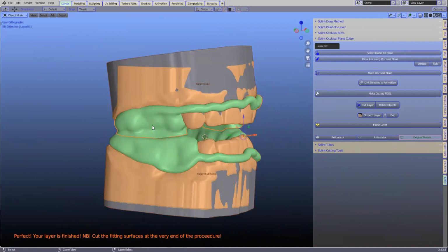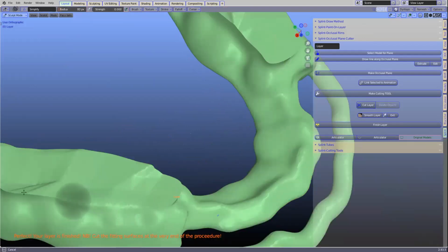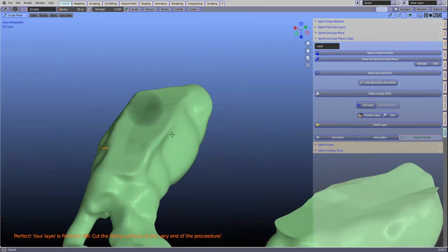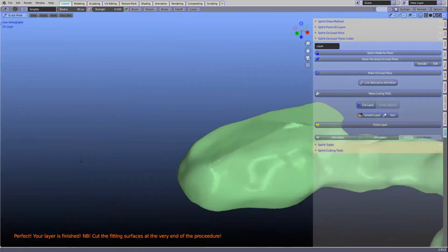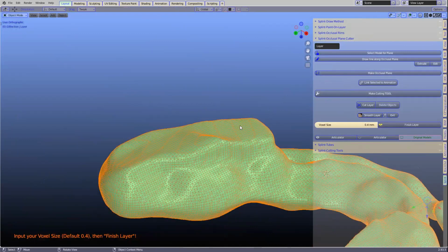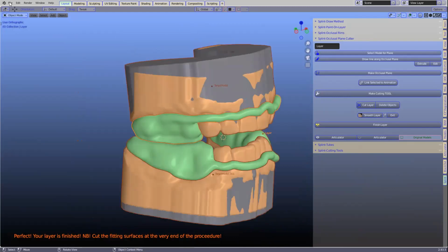Anyway, I'm going to select that, Control I and H, take that one as well, and we're going to give this one a quick smooth as well. So we'll just do this. Okay. If I do this again, I would probably do it way finer than what I'm doing now. But because we've got time restraints and so on, I'll just smooth it like that and exit. Okay, so the next step, what we want to do is put these buttons on there, the other way around.